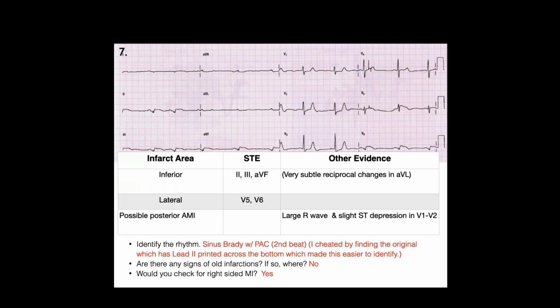Okay, anything else here? I don't think you caught this, Andrew, and I think it's reasonable to get. If you didn't get it on the test, I would mark it wrong: it's the possible posterior. Because there is an inferior, and if you look, that's actually ST. I know you're just learning it, so no big deal. But I want you to get it now. That's why I did that part of the lecture before we went through, so we could pick up all those. Any questions?